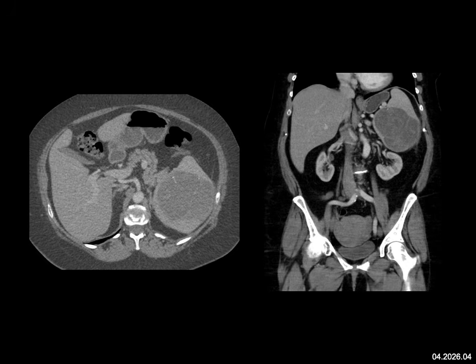The truth is it could be lymphoma. Weight loss, fever is great for lymphoma. Angiosarcomas are usually hypervascular. This is cystic, and so I would tend to favor lymphoma. Couldn't exclude an abscess. Believe it or not, this patient had a splenectomy, and this was an angiosarcoma.